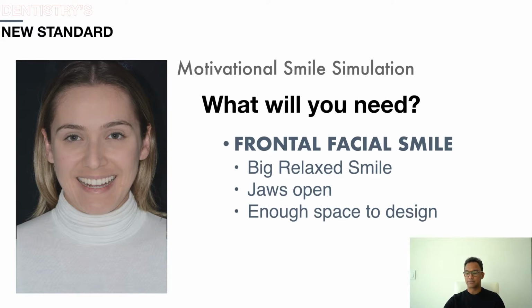And what will you need? You only need one frontal facial picture. The picture must be with a big smile, open jaws, relaxed, and make sure that the eyes of the patient are at the same level, parallel to the lens of the camera. And that's all. And then you start designing. So I will show you here how you can create your smile simulations within 5 to 7 minutes to motivate your patient. So just give me 1 second.